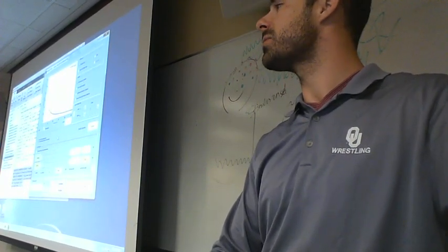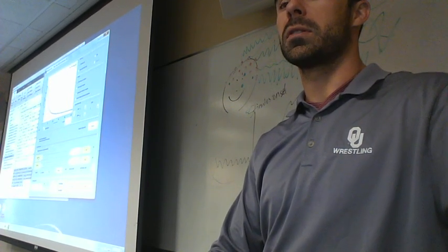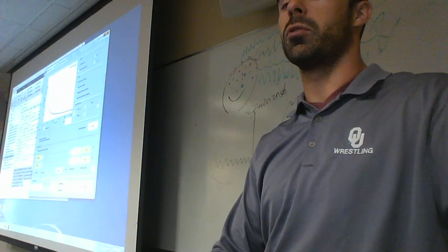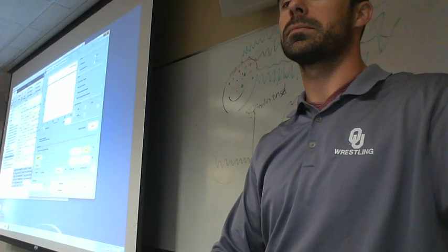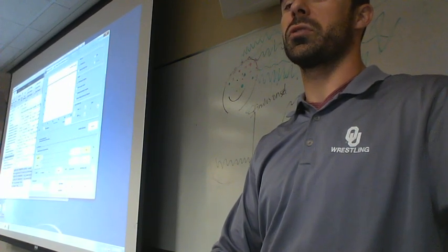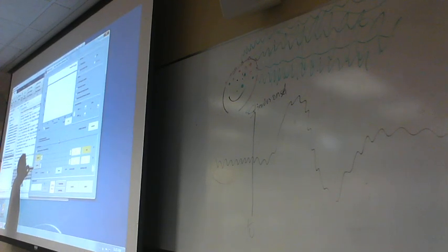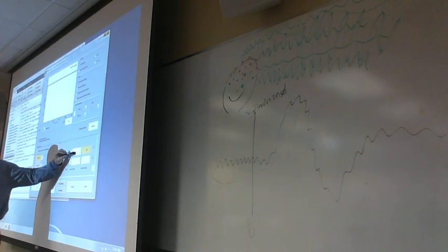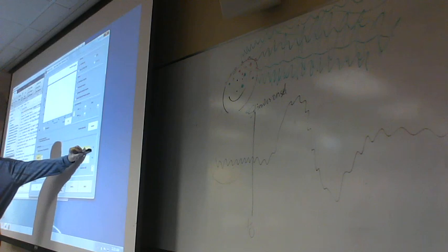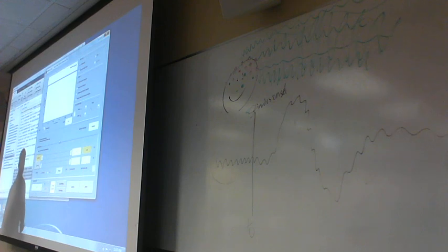What did I say we were going to do? High pass filter. So let's click the button here for high pass, and let's also unclick this button for low pass. So it should look like this. Now, here's what's happening. We are using a high-pass filter, and we're going to set it essentially at 0.1 hertz.